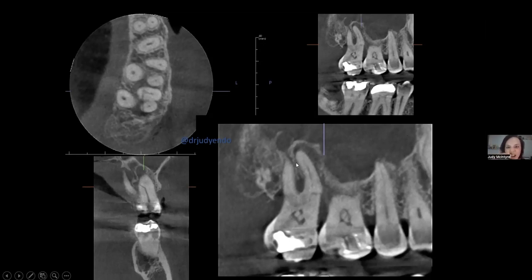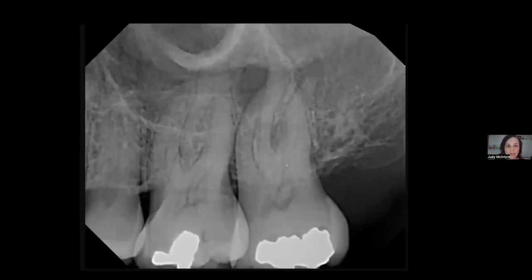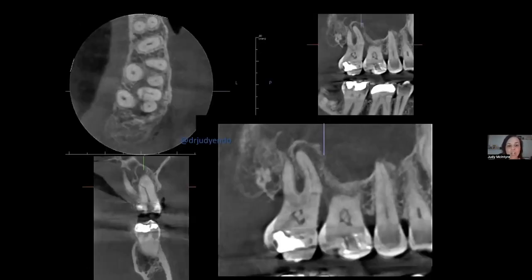This patient sounds nasally because of this sinusitis that's basically due to a lesion of endodontic origin, a lesion of dental origin. This tooth cannot be saved. And while my diagnostics are very good, this 2D image would have never conveyed the extent of destruction that this 3D image really shares, not just with me, but with the patient and also with my referring dentist.